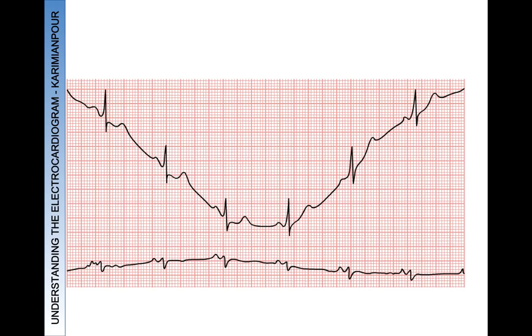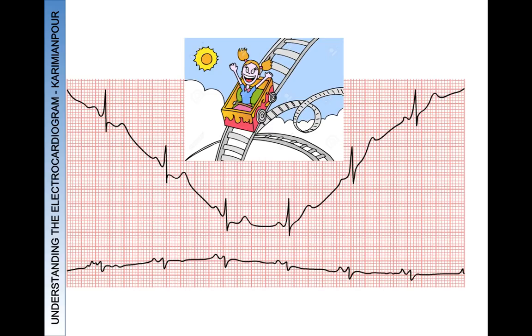All right, so the final practice ECG is this one here, and I'll give you all a couple seconds to pause the video and tell me what condition, or what clinical scenario, gives you this ECG finding. Okay, and this is your ECG when you're on a roller coaster and your heart drops.